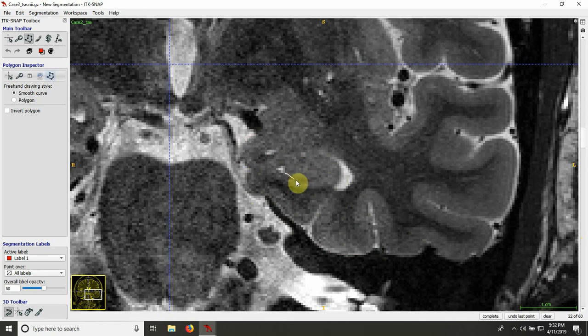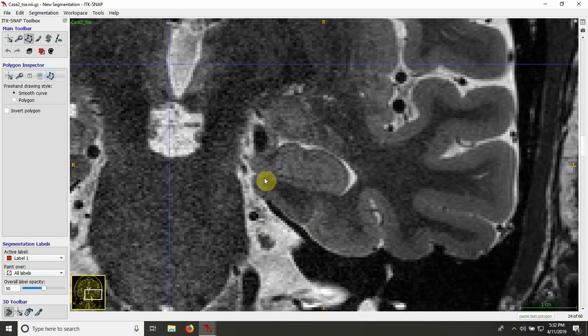And I see the dark band as well, although it's not super clear, but I definitely see portions of it. It's more or less like this. Going a little bit further posterior, again, the dark band is there. It's not clear everywhere, but it's pretty clear. It would be like this, and the outer borders of the hippocampus and the extrahippocampal regions are pretty clear.